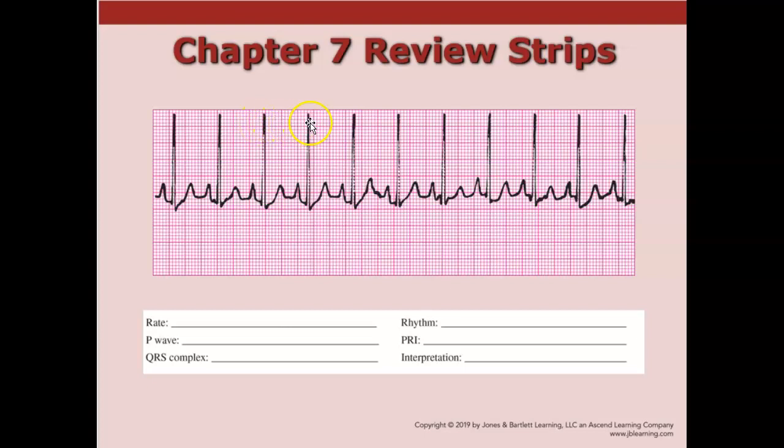1, 2, 3. We got a little bit of difference here, but we still look pretty good. Rhythm looks to be pretty regular. P waves look to be present and upright. Now, when you remember, in the curriculum, it talked a little bit about peaked T waves, but that's fine. We're just making sure right now that they're present and upright.